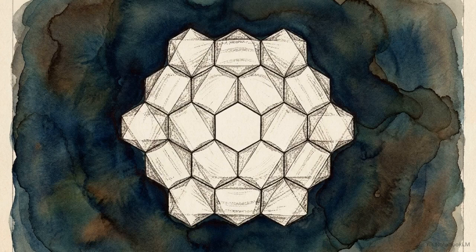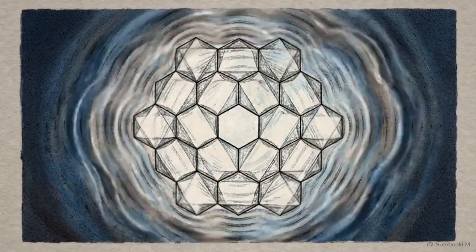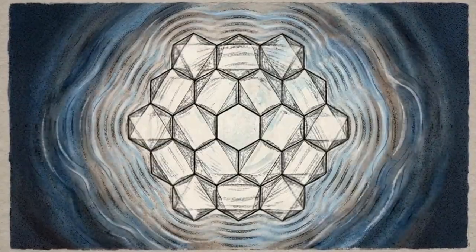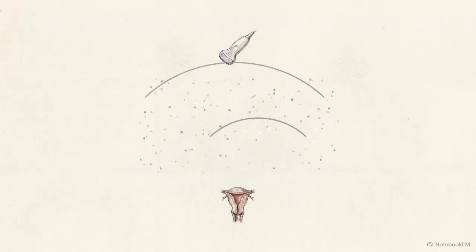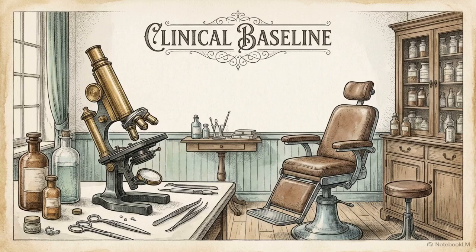This visualization shows the piezoelectric effect in action. When an electrical pulse hits a lattice of specialized crystals, they vibrate, converting that energy into high-frequency sound waves. Those waves travel through tissue, reflect back, and create the diagnostic images we rely on in obstetrics and gynecology. The clinical application of this physics begins early.